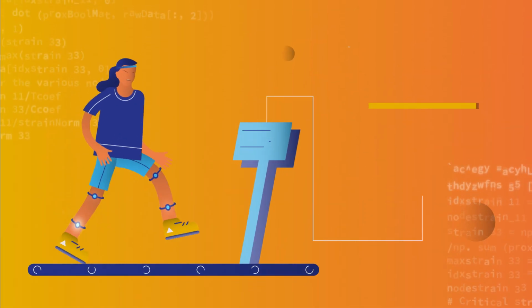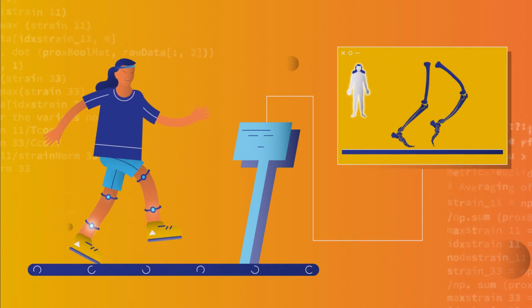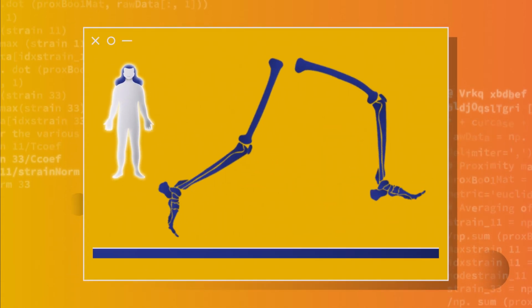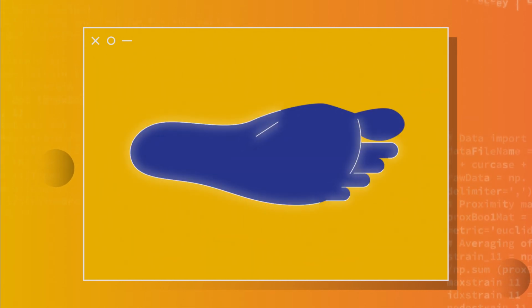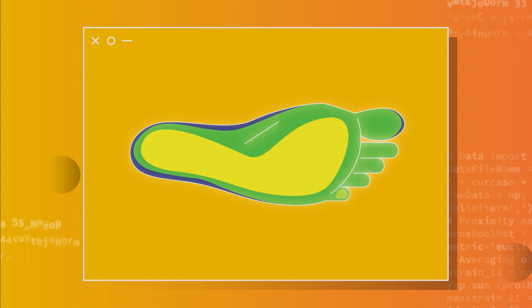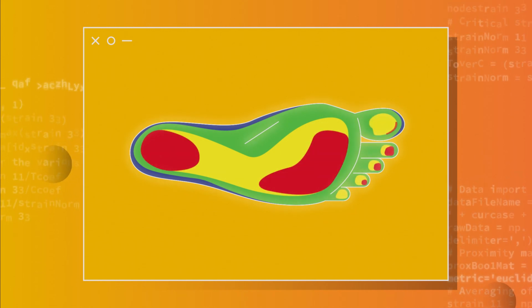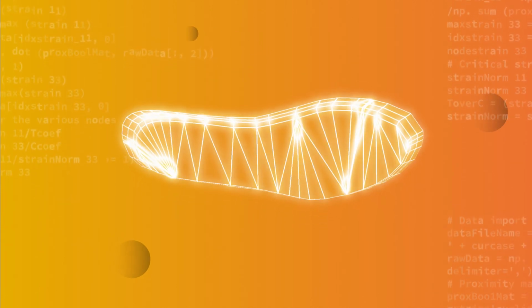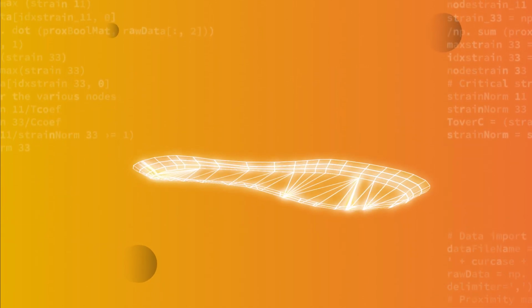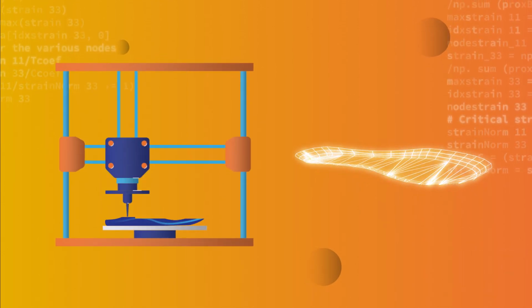Advanced computer model simulations combined with motion capture technology allow us to understand how each patient walks and predict how a patient's foot will move. The insole solution uses such technologies to virtually test many different candidate insoles and find the best fit for a specific patient. Therefore, by combining computer models with 3D printing, we can achieve improved personalization, superior performance, and correction.